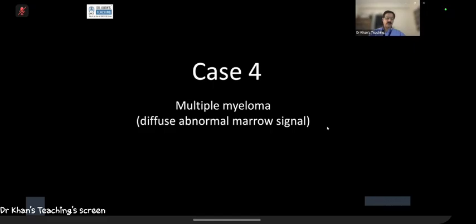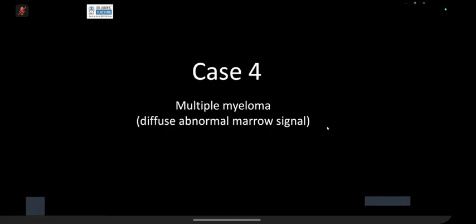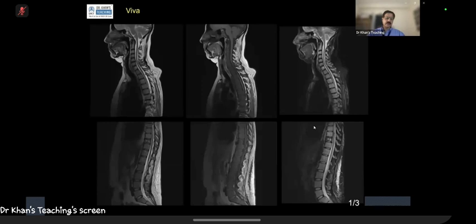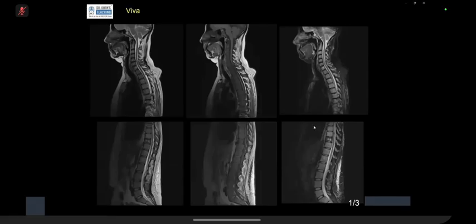But on a T1 weighted sequence, the findings were picked up. I'll elaborate once again when I go through the DICOM. Then we asked for whole spine, and on a T1 weighted sequence you will see the findings were quite emphatic. So, classical satisfaction of search. Please remember I've shown you many times how to report a CT brain, how to report an MR brain, and base of skull, bones, everything. Whatever is visible, you must see it.